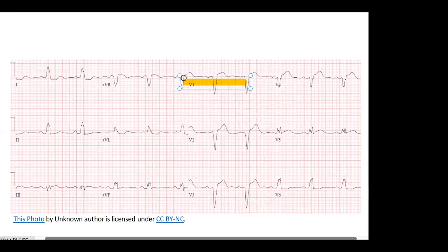So what happens is you get an image like this, you get a left bundle block because of the scars which get built in the left side of the heart. This results in a left bundle branch block if the patient is lucky enough, and worst case, it ends up becoming just an ST elevation which disappears after a rupture of the heart or when the patient is dead.